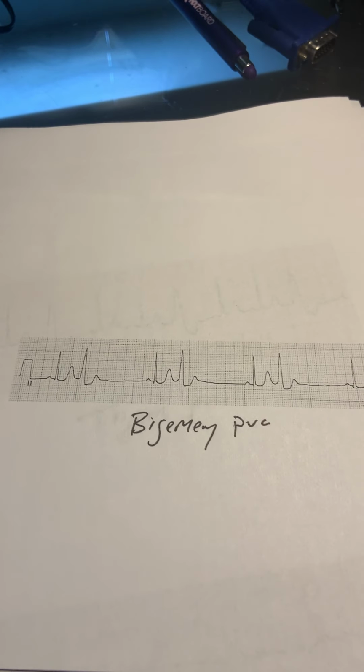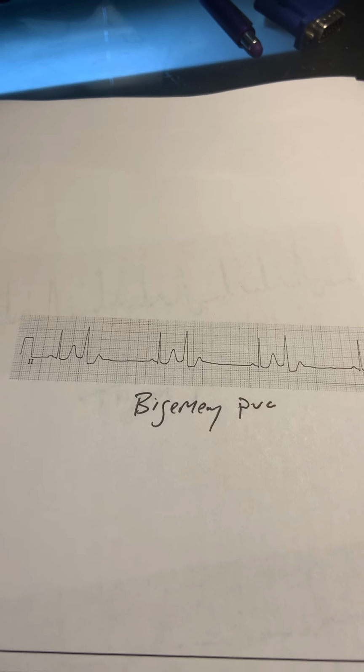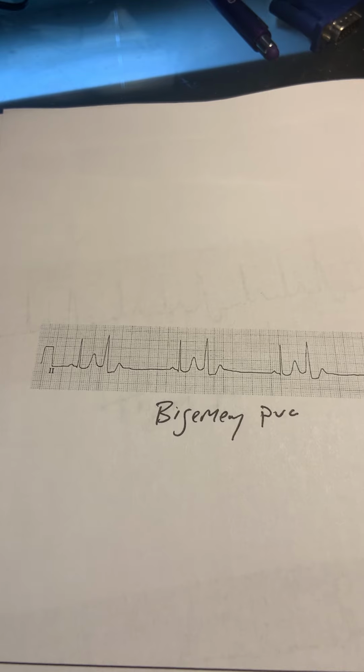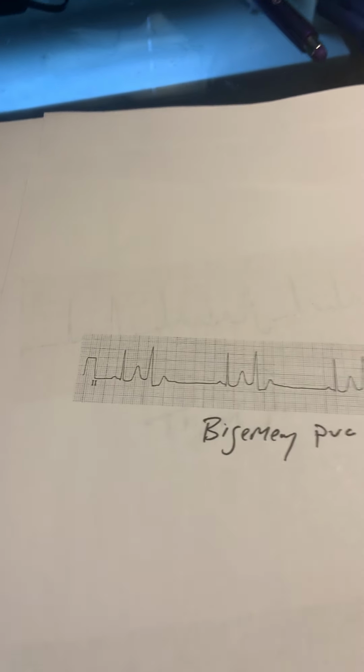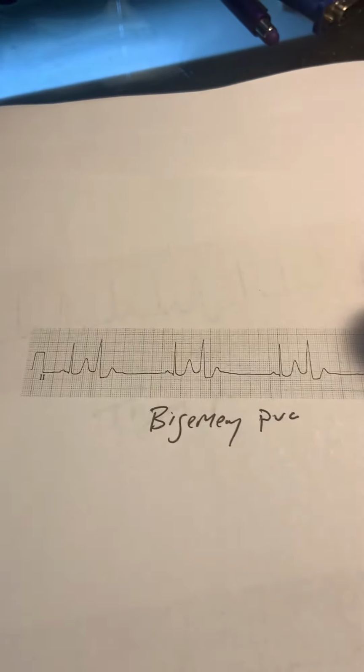Not really something that is going to affect you in the field, but it's just something good to know, so that way if you're correlating with the patient's manual pulse, you can figure out if these are perfusing or not, and know and understand what you're looking at.